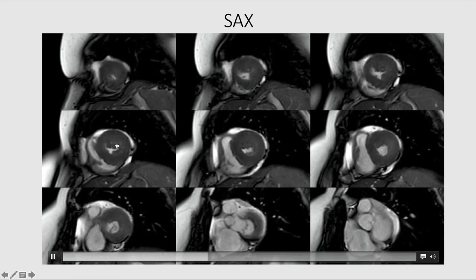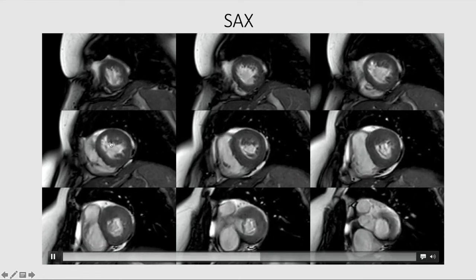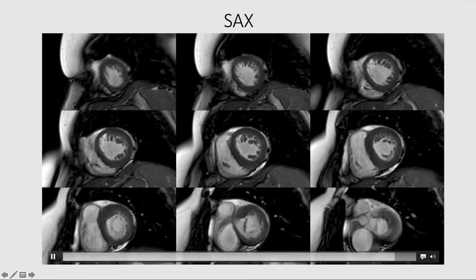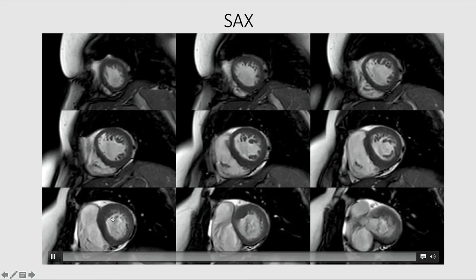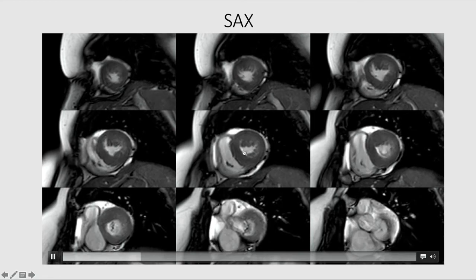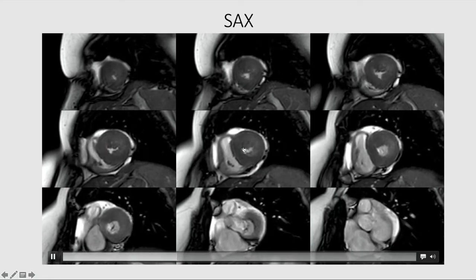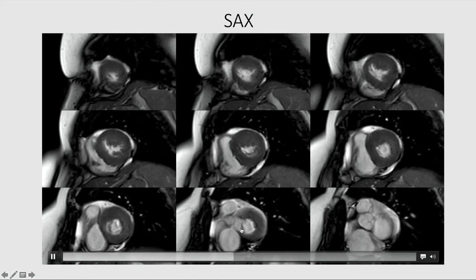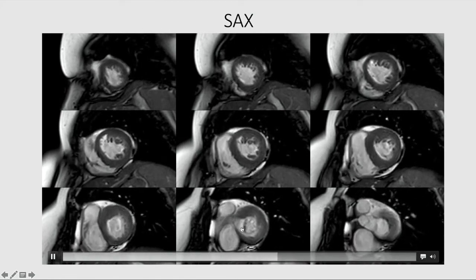which is anterior to the anterior papillary muscle. This is the anterior papillary muscle. This is the apical-basal muscle bundle, which is very prominent in this patient. If you trace that to the base, you can see that during systole, near the mid and basal slices, this apical-basal muscle bundle along with the anteriorly displaced anterior papillary muscle are coming towards the interventricular septum, leading to dynamic LVOT obstruction. You can see the turbulent flow in the LVOT cavity here.